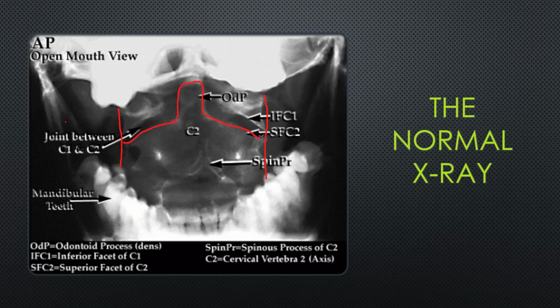So when you're just having a glance in an emergency department, where we often don't have time to do major, long reviews of X-rays, these are essentially the 2 most important things that you are looking for. You can have fractures, you can have dislocations. There's quite a bit that you can have.